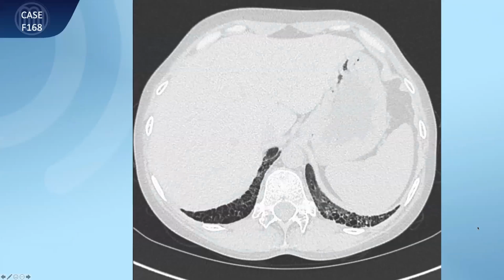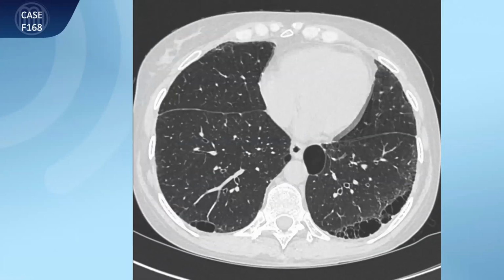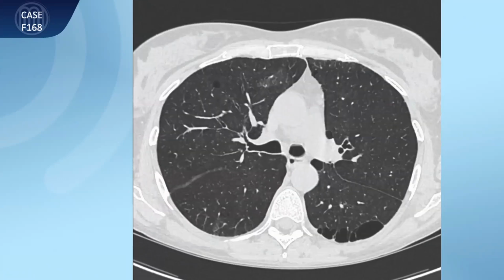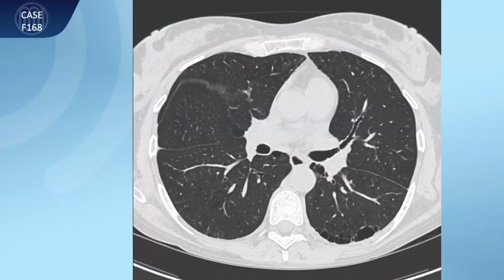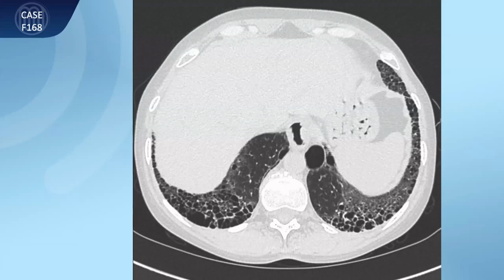So let's go to the case and look at the CT pictures here. And this looks quite different from what I told you before. I'd like to ask you first, and then, in order to give you an impression, I will walk through the pictures. Now I'd like to ask question set number 2, with the different CT patterns. Which CT pattern would you describe here? Could you start the polling, set number 2?